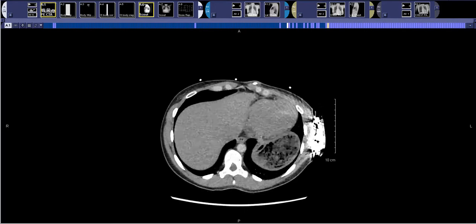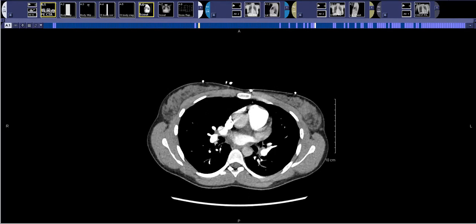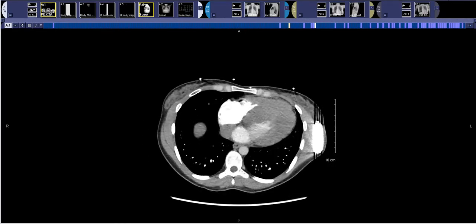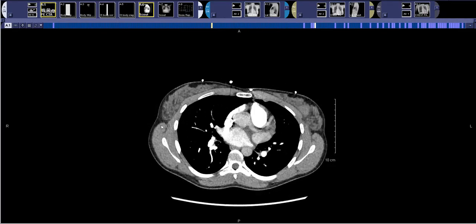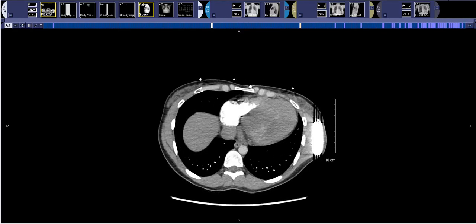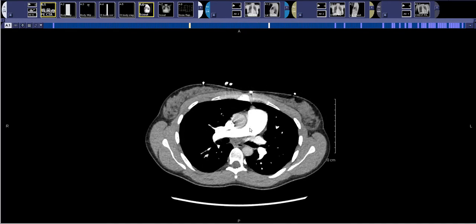Look by the esophagus. One thing I haven't mentioned before is I usually am also looking at the anterior chest wall while I'm on soft tissue windows and posterior chest wall musculature as well. After I've finished looking at the mediastinum and the chest wall, then I switch to looking at the heart. Since this is a PE study, part of that search is that I will look at the pulmonary arteries.